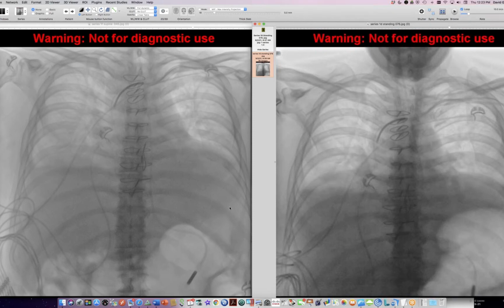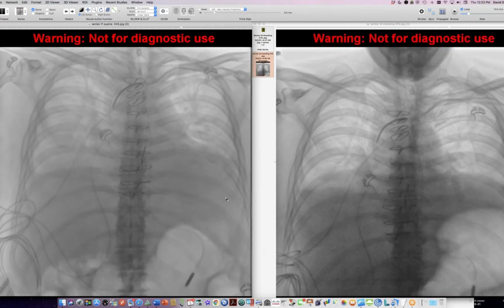And so I always include the partially recumbent and then the fully supine views as part of my diaphragm fluoro, especially when there's a question of bilateral paralysis. So if somebody is dyspneic lying in bed, they can't go supine, or they can't tolerate wading in water that covers their abdomen and chest, so that's called dyspnea on immersion, then you have a strong suspicion that you're dealing with bilateral paralysis. And the standing views are not going to bring that out. You have to do the supine view.